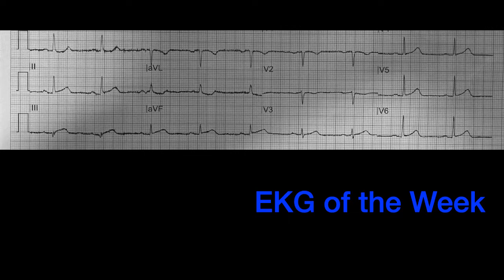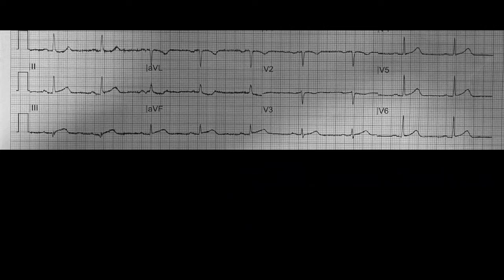So we'll say that the context is sometimes important. In this case, it's an adult with shortness of breath that this EKG was performed on. So let's look at the old EKG. And again, if you need a second, and probably it's a good idea, go ahead and pause, make an assessment of this EKG, and then we'll pick it back up in just a second.